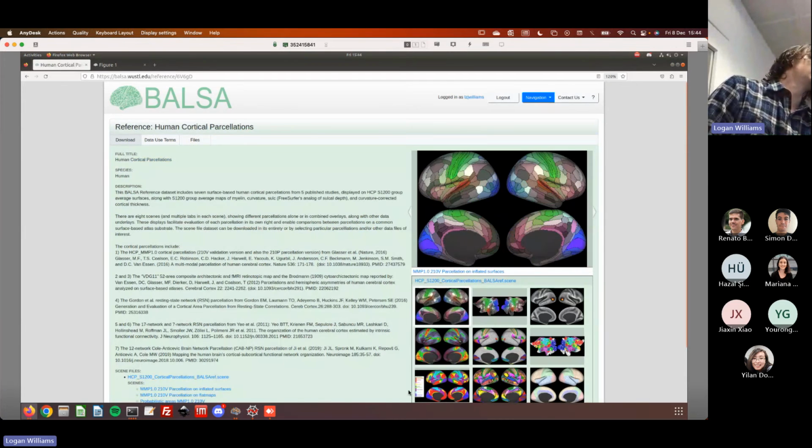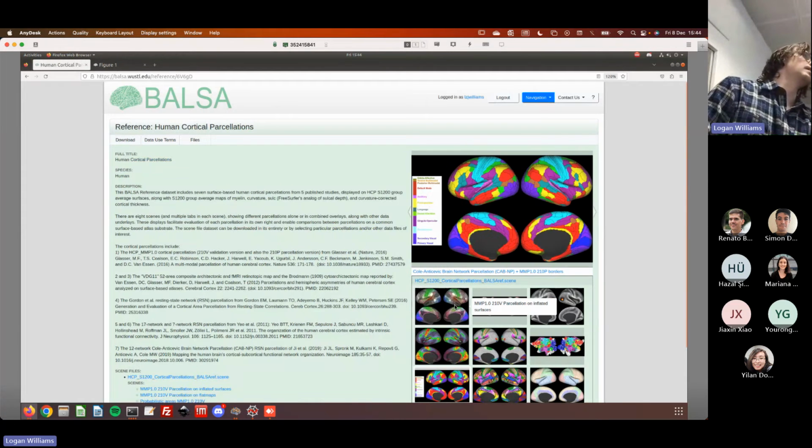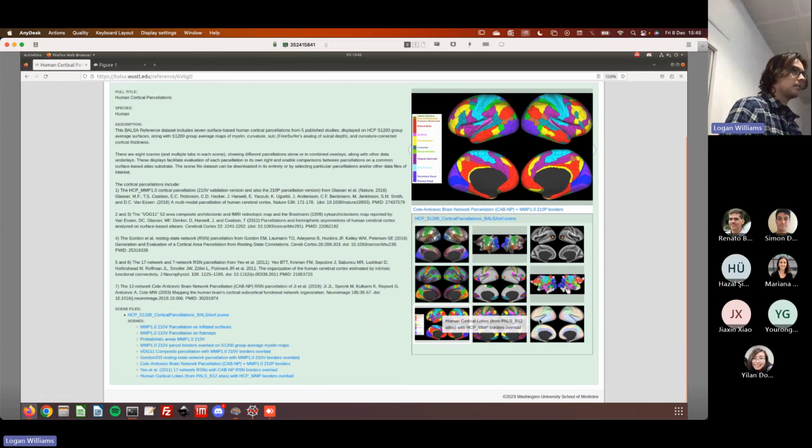So for instance, you can do something like this. This will be a figure that you can make in Workbench. I just meant for ones that you really can't make, like maybe a method and then there's some error or whatever. Exactly. So if this existed as a JPEG or a PNG file, it could just be uploaded to the scene and moved there. So it's very flexible, super, super cool.